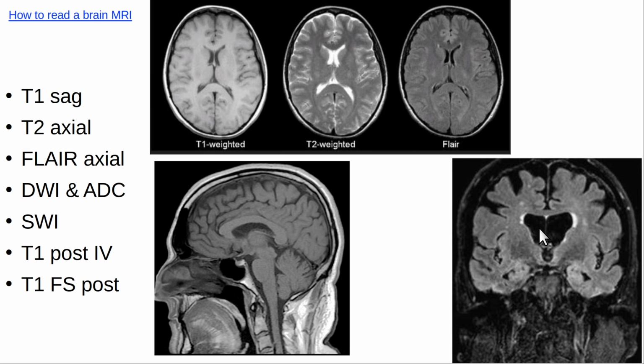Okay, so there's techniques on MRI where you can suppress things. So we suppress the signal of the fluid so that we can see pathology adjacent to the ventricle better. Here is a subcortical lesion, and we can see this better on this FLAIR sequence than we would on a T2 sequence because the adjacent CSF is suppressed. If you've got bright fluid, a lesion next to the ventricles, for example, would be suppressed by the ventricular signal in the sense that it would be like squinting into the sun.